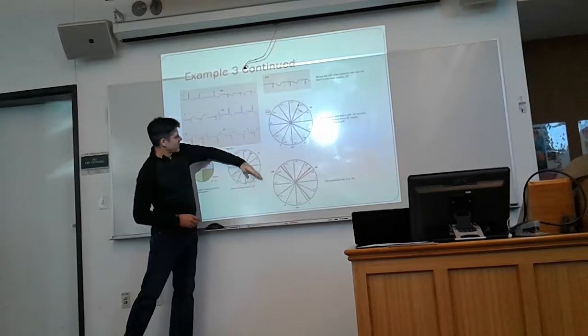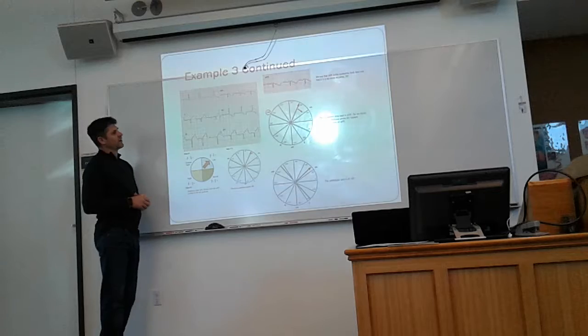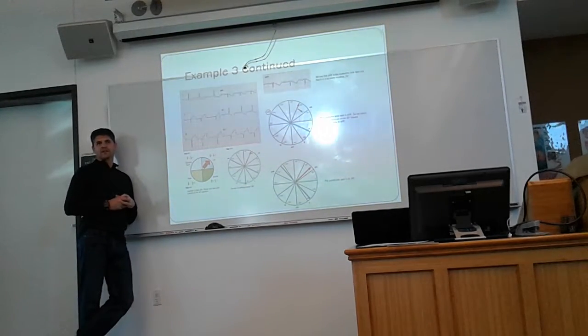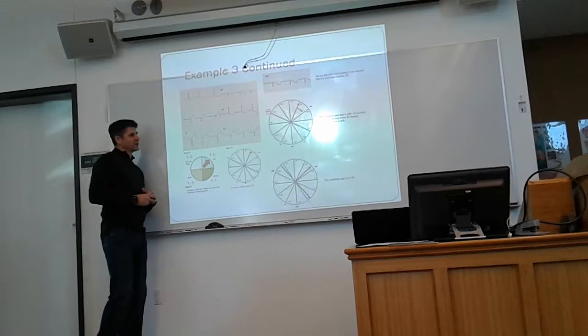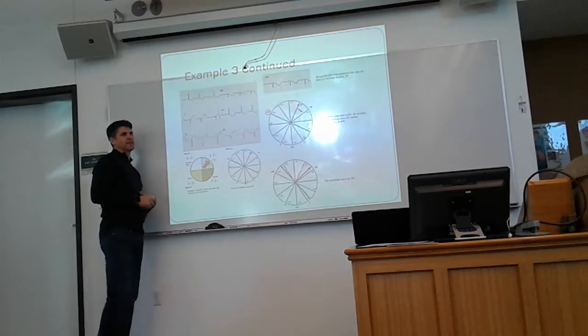So we have our line on AVR. And as we're trying to decide if we're shifting towards or away, is it more negative or more positive? Negative. How much more negative than positive? Quite a lot, right? So we're going to shift it a good 15 to 20 degrees.